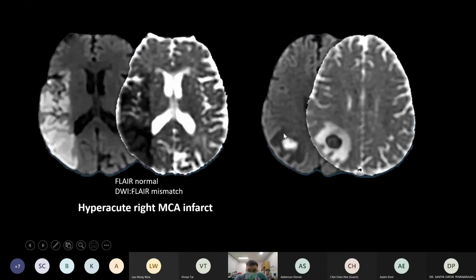And like I said, most likely, because of this surrounding finger-like projection, some form of vasogenic edema is going on, which is going to be dark under DWI because there's no diffusion restriction. In fact, there's an increase in terms of diffusion. So vasogenic edema will appear like this. It will appear dark in DWI and white in ADC, as opposed to cytotoxic edema.